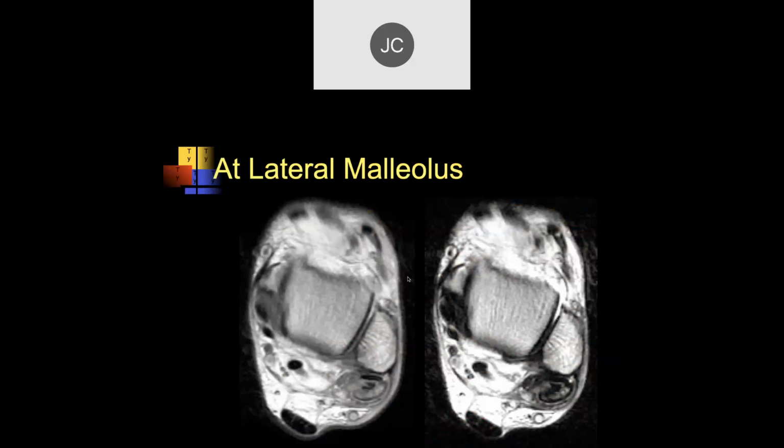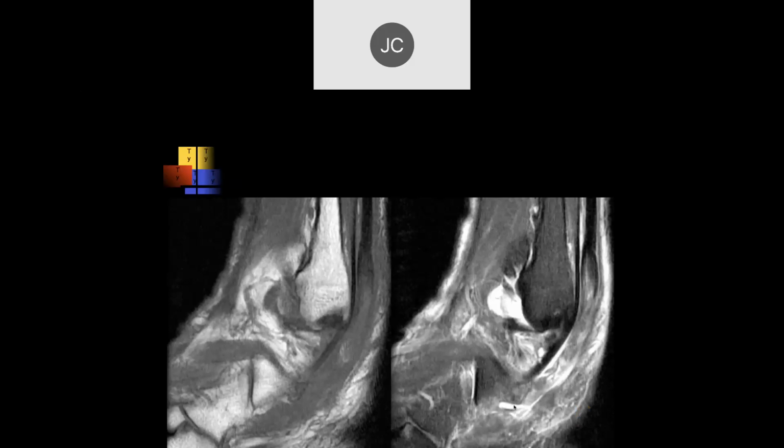Right, so posterior to the peroneus brevis, we just see, can't really make out a nice tendon there. There's just soft tissue thickening. Yeah, the peroneus longus, it looks like there could be a tear, maybe. Yeah, I think this is actually a full thickness tear with proximal retraction.